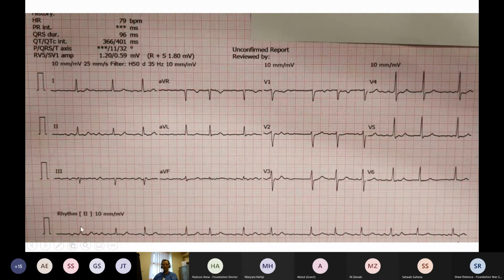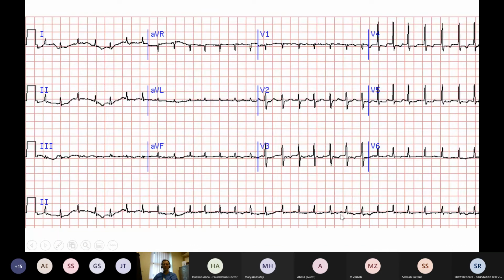So this is atrial fibrillation with an irregular rhythm. And the way to spot that is to mark it out. So does everybody agree that this is irregular? And you're looking for more than about a 25% difference between the longest and the shortest RR intervals. So that's rate-controlled atrial fibrillation. We move our piece of paper along, we can immediately see that it doesn't line up, that this is irregular.